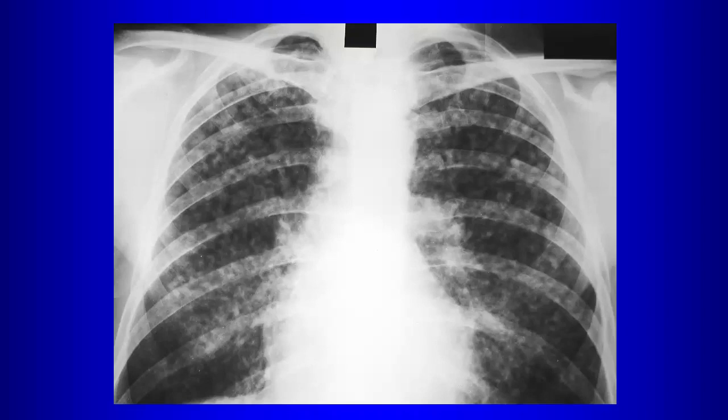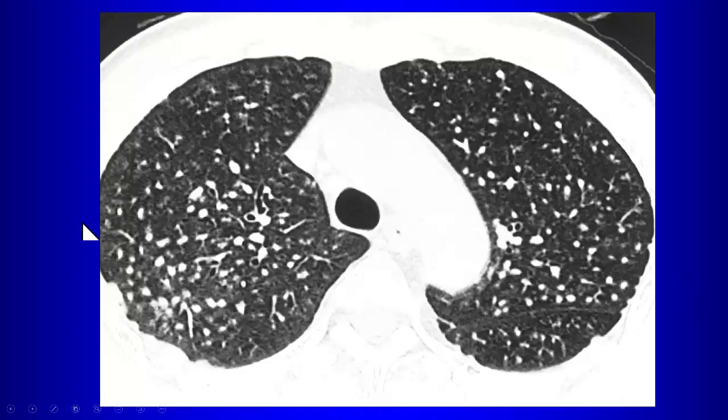Anything else? Well, hypersensitivity pneumonitis. What's different about the nodules in that versus this? That can also give you disease in an upper lung distribution, but they tend not to be as dense, right? So they're not as dense as these nodules with HP.